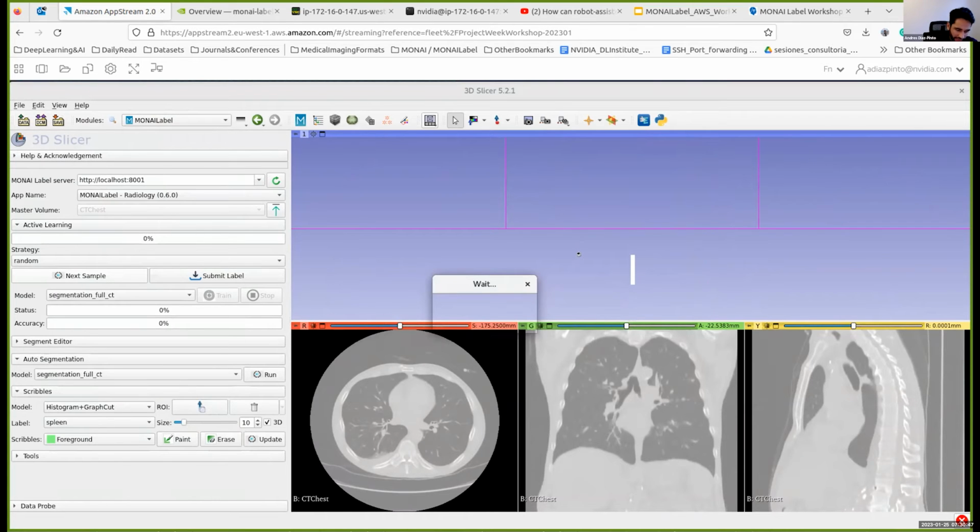So this is to point out that MONAI Label is very flexible. You can train any network as long as you have the data set organized in that way and define the segments. The MONAI Label model will train that and deliver good results.